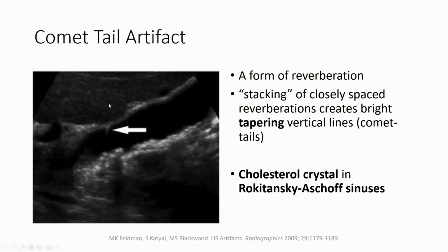And then this image is actually reflecting cholesterol crystal in Rokitansky-Aschoff sinuses, which is diagnostic of adenomyomatosis. This is also another example that ultrasound can help the diagnosis.